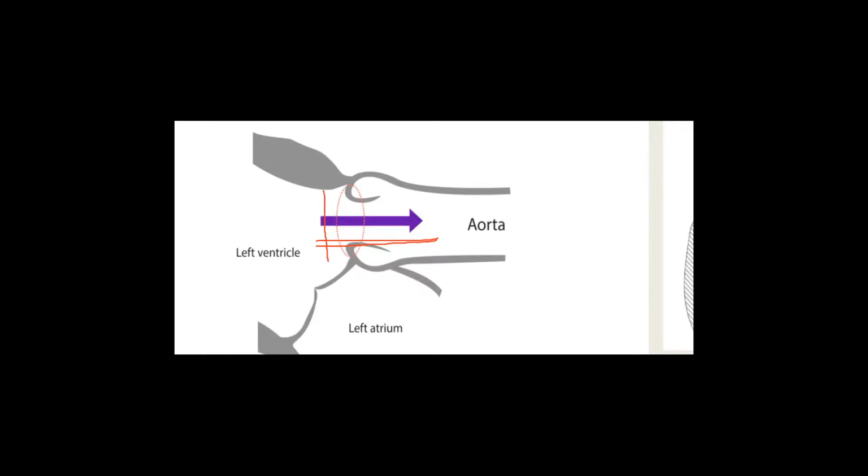You see it? So this is the diameter. What else do you need? I will multiply it twice, and then by 0.785. So 0.785 multiplied by the diameter squared. And then you multiply it by TVI.